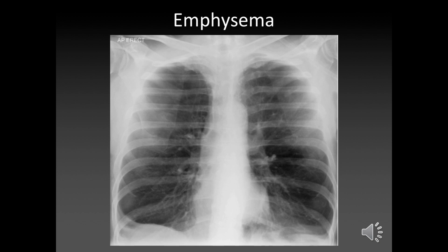Now looking at the lung fields, the upper lung field, nothing particularly abnormal. And then you look at the middle lung fields, and there's something here. Can everyone see that? So what am I saying is abnormal there? How would you describe that lesion? Can anyone not see anything there? Okay, good. Because it is quite difficult to pick up, and if you can't see it, you can't see it. Can you see what's there?